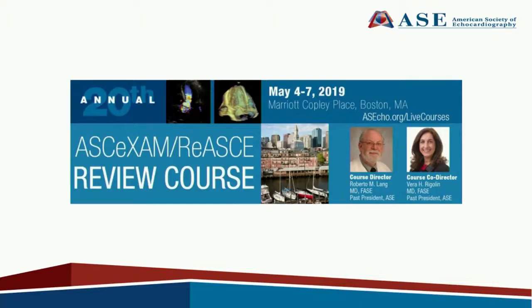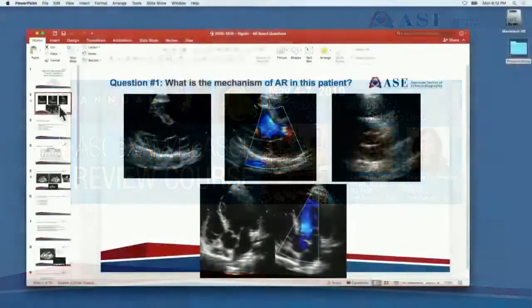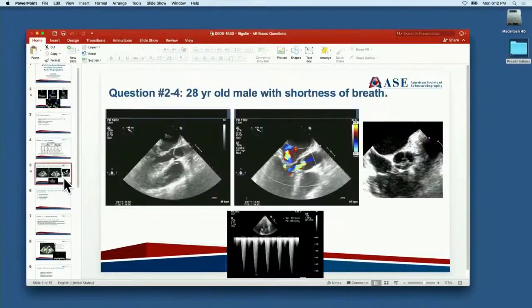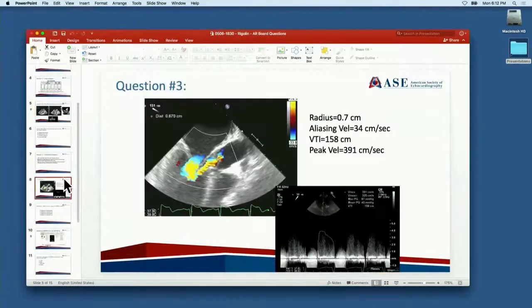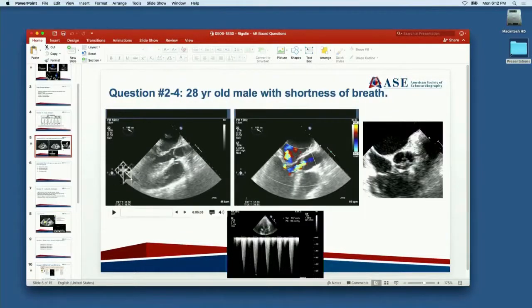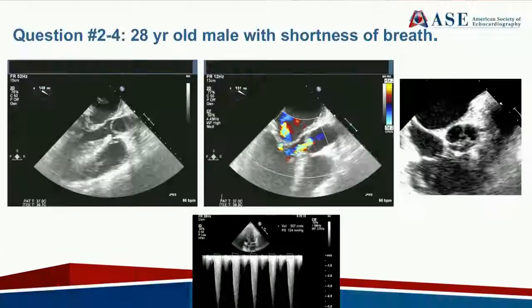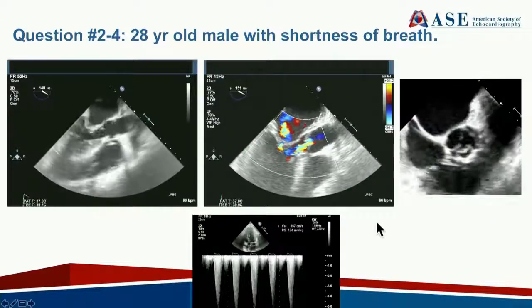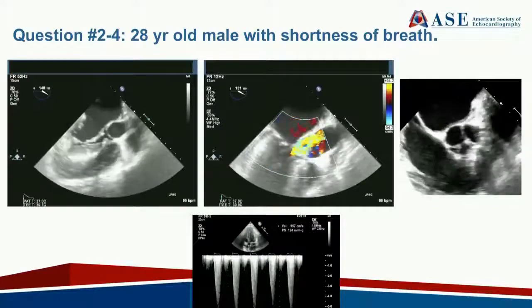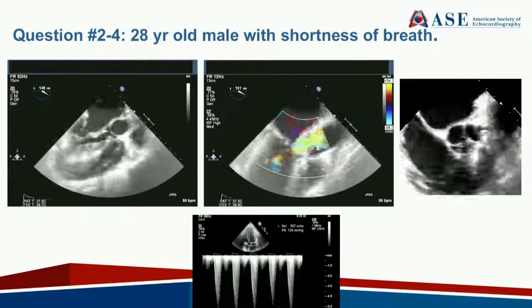All right. I'm going to skip ahead to this question. This is a 28-year-old male with shortness of breath. I want you to carefully look at all the images.